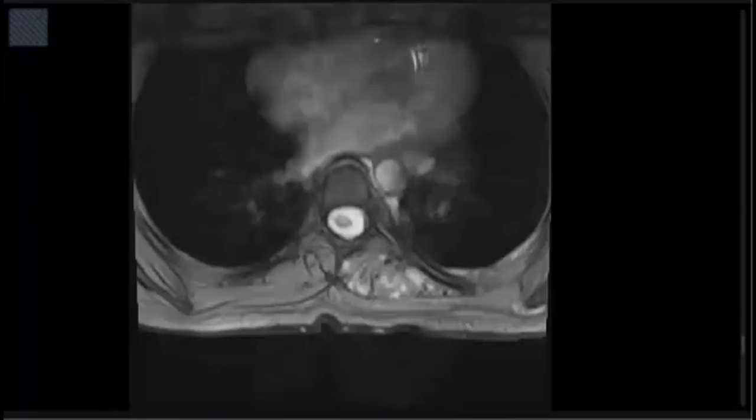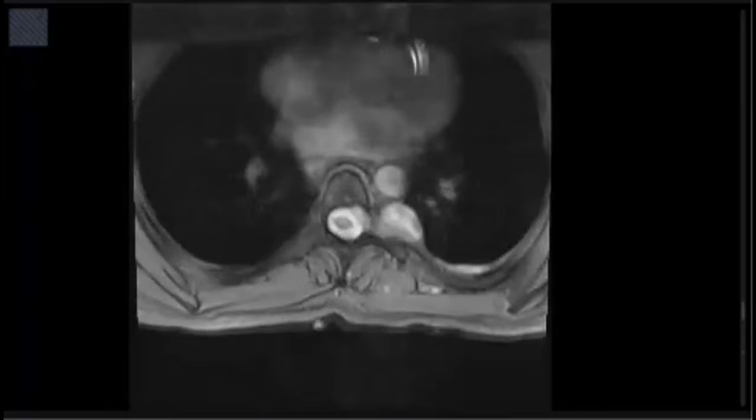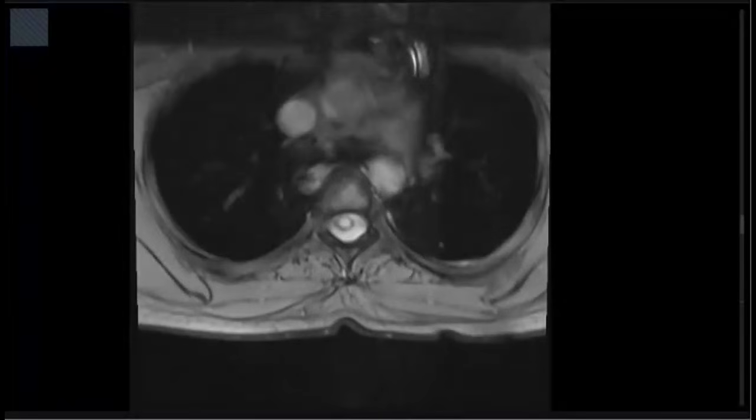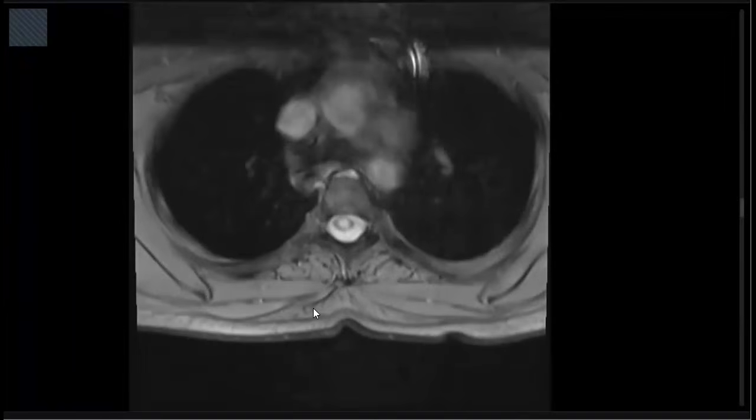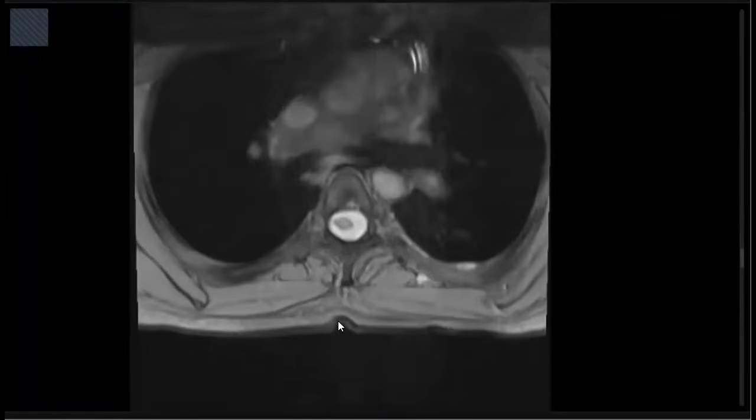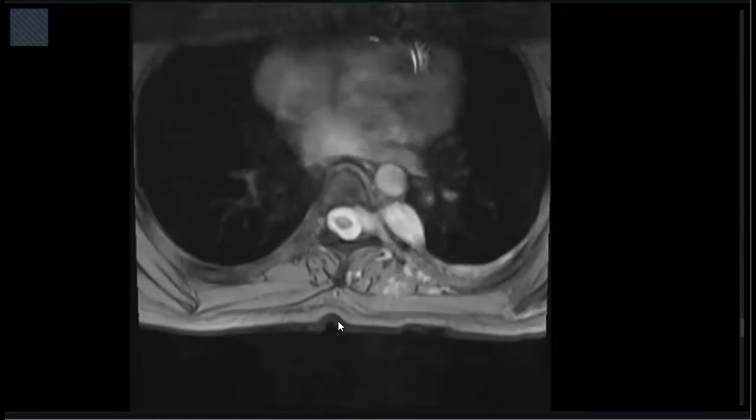I have also seen this extradural lesion on the left side, and this could represent a schwannoma or neurofibroma. And this cutaneous lesion was worrisome for cutaneous nodules such as neurofibroma. If you found plexiform neurofibroma, syringomyelia, subcutaneous lesions and intramuscular lesions, what should be your diagnosis?